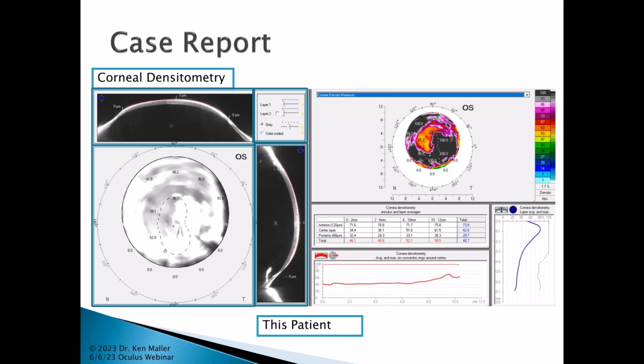Over here, again, I still have the layers right up at the anterior surface because that's where most of the scarring is. But if we take a look here, we can see the entire solid blue line has been shifted a little to the right, again, with the bulk of the scarring up at the anterior layers of this particular cornea. Here on the annular assessment, it's fairly equal, stretching from center out to edge at about 8 millimeters where it starts to increase. But if we take a look up over here, we can see it really is the anterior surface that's accounting for the bulk of the reflectivity.